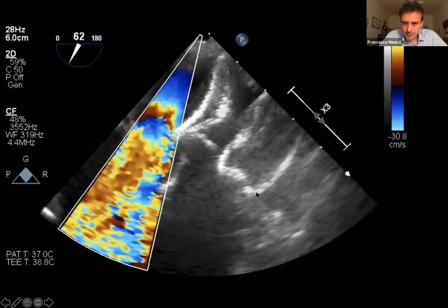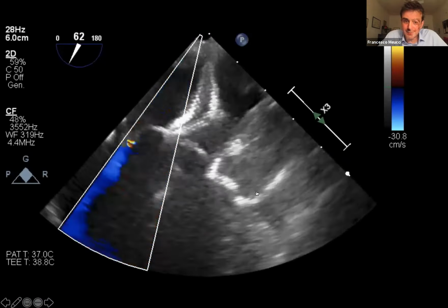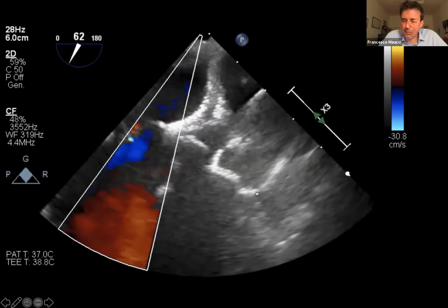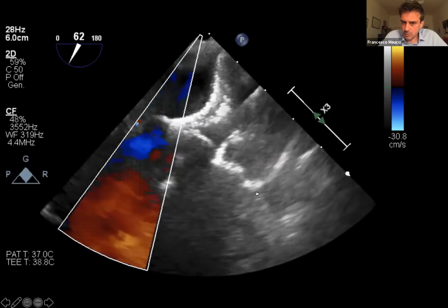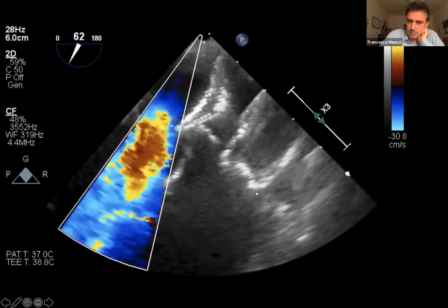This is the interference of the disc, that is well positioned outside the appendage, with the mitral prosthesis. So we had something wrong: the disc was a little bit too big for this anatomy and was impinging the mitral valve.